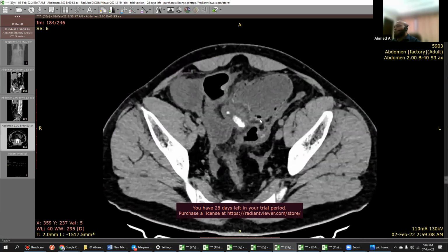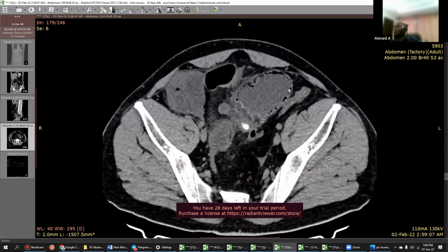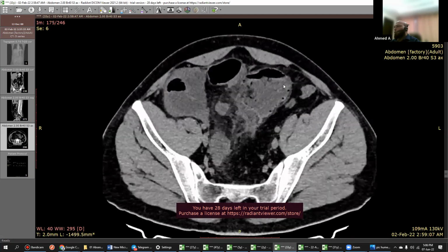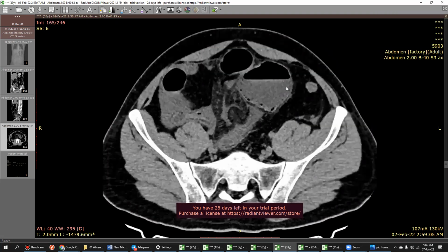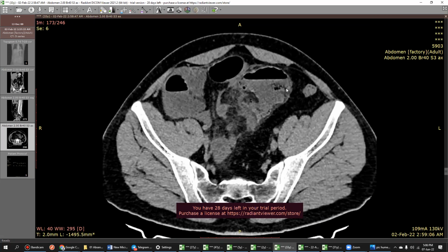I would not say it is impending ischemia because you have to give contrast, but yes, there is pneumatosis along the cecum. This was ignored. And a very important thing: this is not malrotation, this is non-rotation. Okay, remember, this is non-rotation.